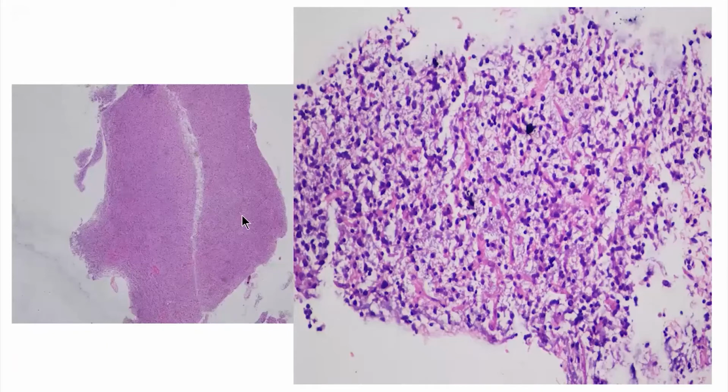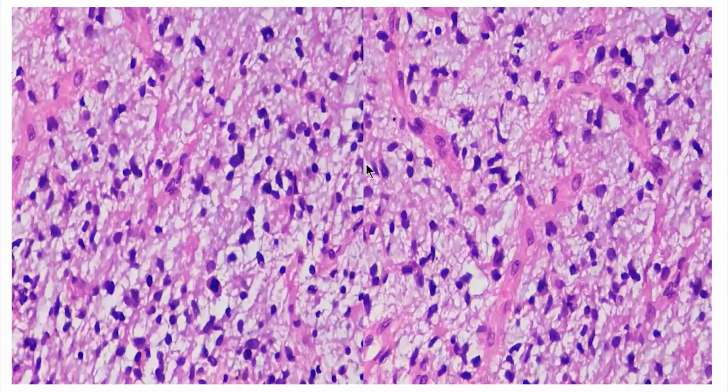So this was the only tumor tissue bit which we got, and definitely we could see that the cellularity is a bit towards the higher side, and the cells are relatively uniform with minimal pleomorphism, and there are branching vessels in the background with some myxoid kind of fibrillary matrix. But yes, we could see the mitosis, in fact, two mitoses in a single high power field. So definitely the increased cellularity, cells with minimal pleomorphism raises the suspicion of a high-grade glioma.